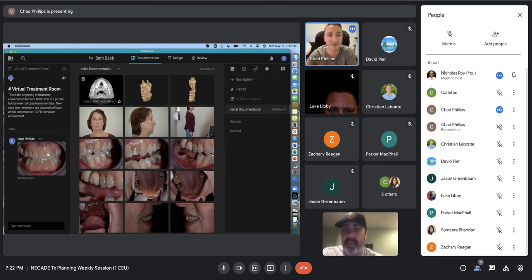But it's got to be on the right track if I can hover over this and it goes through. I think just the way it needs to be imported is a little bit different than what I did. So it's possible. I just need to figure that out. Yeah, my guess is they have a cloud-based viewing software that it uploads it to, and then this would just be a portal to it.